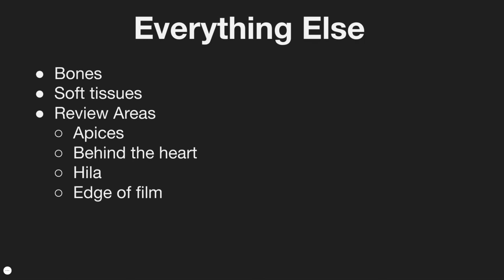Research suggests that these children often present multiple times before being identified for a full workup. And spotting an injury could be one of the most important interventions you can make. You look at soft tissues, looking for any obvious subcutaneous mass or air. If you see air in the neck, then you need to go back and assess the mediastinum closely for any evidence of pneumomediastinum.